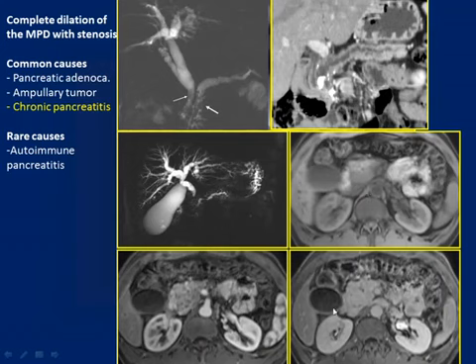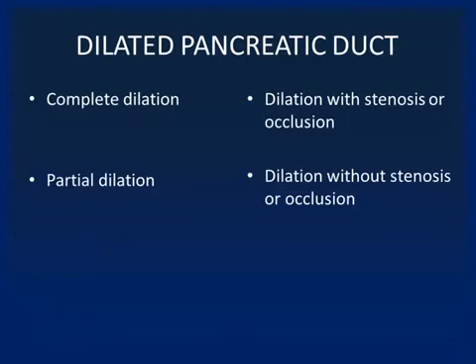But following contrast enhancement, we do not see the low signal intensity area we usually see with pancreatic adenocarcinoma. In the equilibrium phase, we see that there is a late enhancement. And we learn that this is one of the features of autoimmune pancreatitis. Additionally, if we look closely at the main pancreatic duct, we see multiple strictures. And multiple strictures are another feature of autoimmune pancreatitis. So this case was effectively an autoimmune pancreatitis.